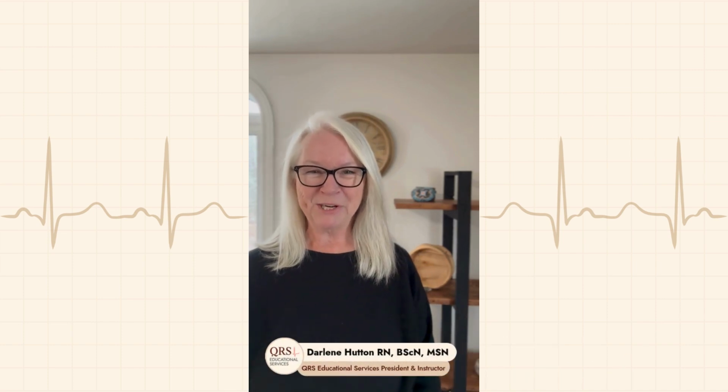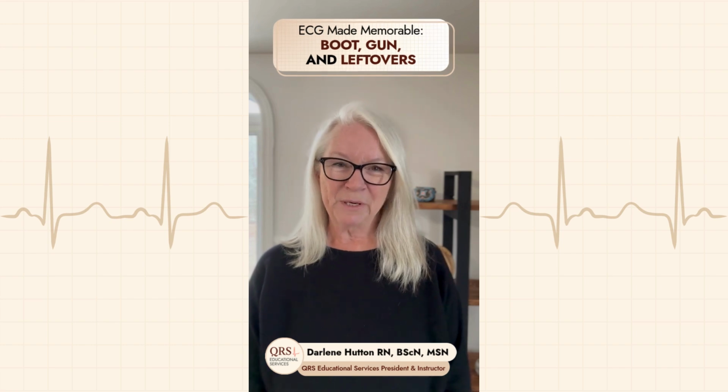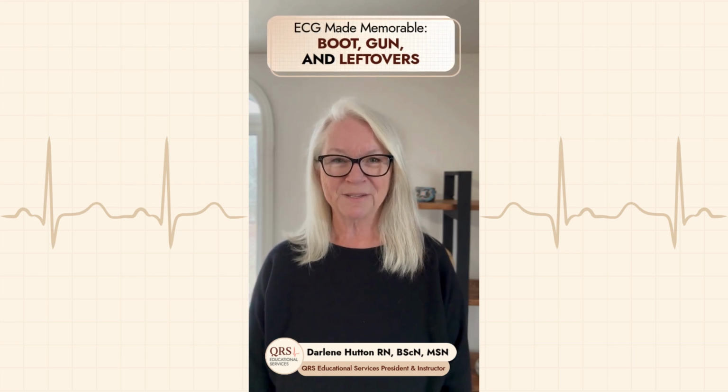Hi everyone, I'm Darlene with QRS Educational Services, and in this session we're going to be looking at the different parts of the 12-lead ECG and how they correspond to different parts of the heart.